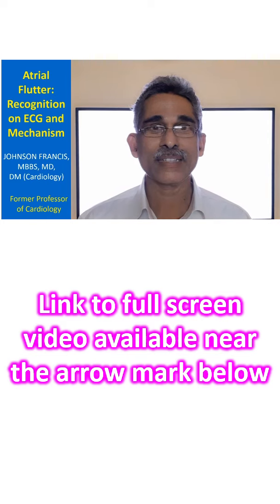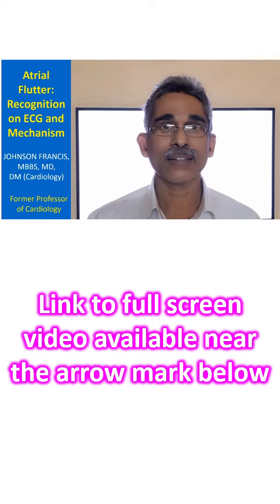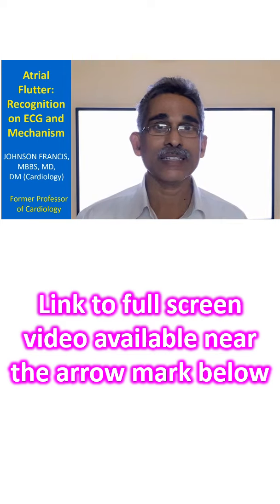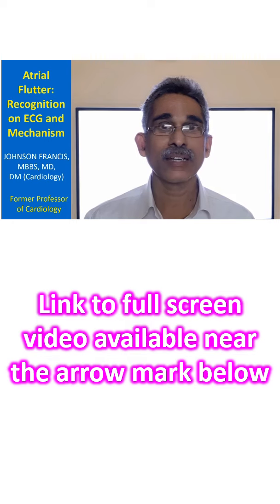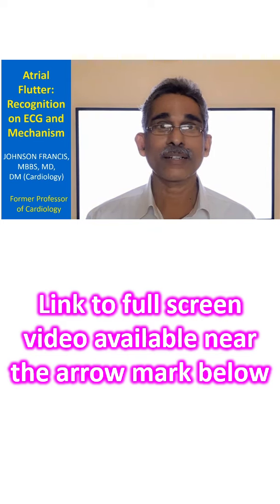Now I will be discussing an ECG with atrial flutter, and the mechanism of atrial flutter will also be discussed. Even though in the ECG which I am going to present first, recognition of atrial flutter will be very easy, but do not think that it is always so easy. Atrial flutter is an arrhythmia which can be missed on the ECG, which I will come to during the discussion.